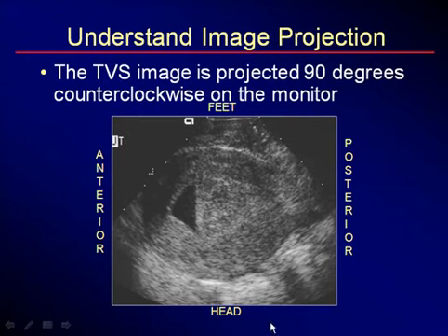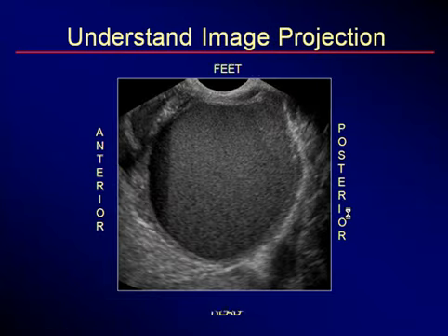We have the uterus, and it has an interface here in the middle of the cavity. Now we know that this is anterior and this is posterior. So that means that this fluid level is in a dependent position. And the fact that it is up and down on the picture doesn't bother us now, because we know that something is layering within the uterus, because this is anterior, this is posterior.